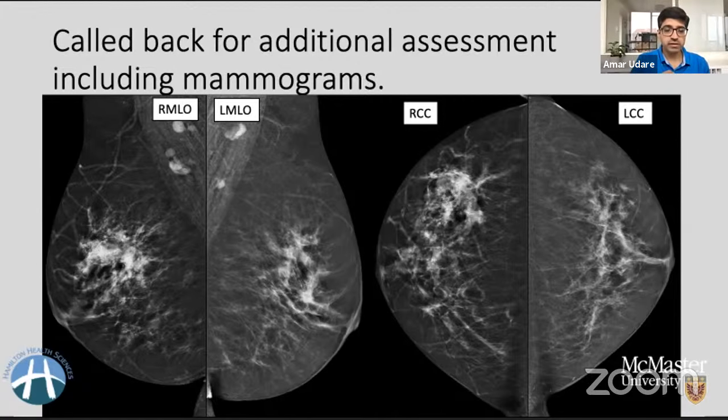So for breasts which have a large carcinoma hiding within that dense glandular tissue, you are going to see that it is trying to absorb a lot of photons. So the breast is going to need more radiation to provide you with the same appearance as that of the contralateral side. So if the exposure is higher, the fat is going to appear darker as compared to the other side. And that's exactly what is happening.